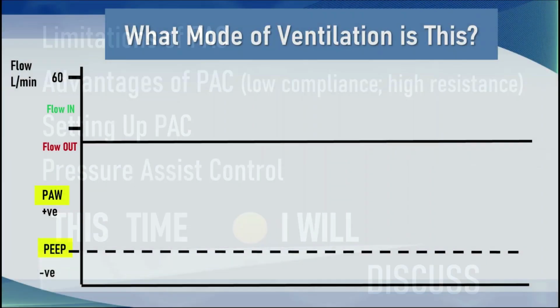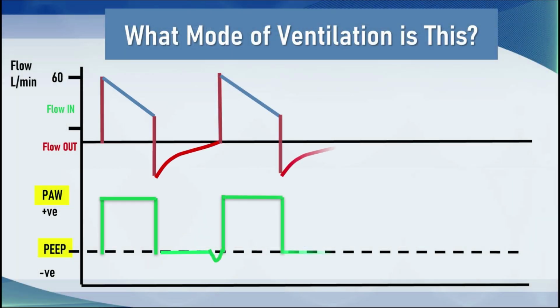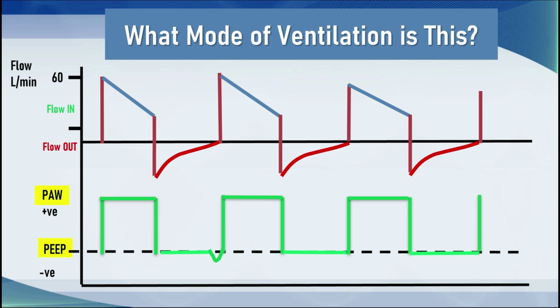First of all, I just want to show you one set of waveforms. If you were to look at a ventilator without being terribly curious and you looked at this waveform, you may be misinterpreting what's on it. And the reason why is when you see this inflection point here in the flow waveform, you immediately decide that this must be flow limited ventilation, in other words flow cycling, like you see in pressure support. But in fact, this breath here is a non-assisted breath. It's a controlled breath. So this is a control mode of ventilation where flow is shutting down.